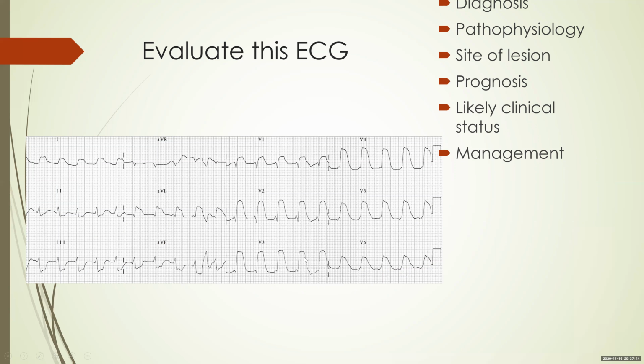You can see this tachycardia on the ECG. The heart rate is around 100 to 120. This signifies that the patient is going in for heart failure or is probably in heart failure. Again, this is just a clue. If you see tachycardia in anterior wall MI, especially at fast heart rates, you think that this patient has gone in for heart failure or will go in for heart failure.